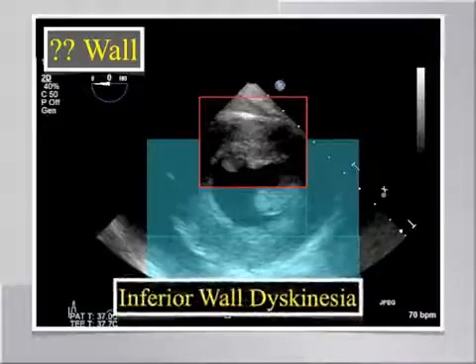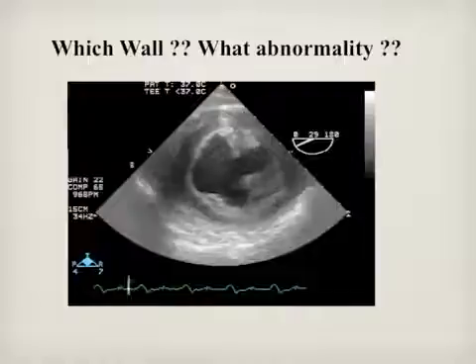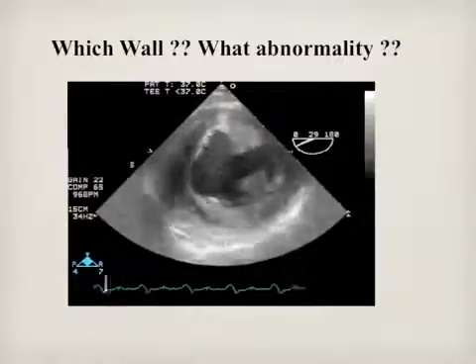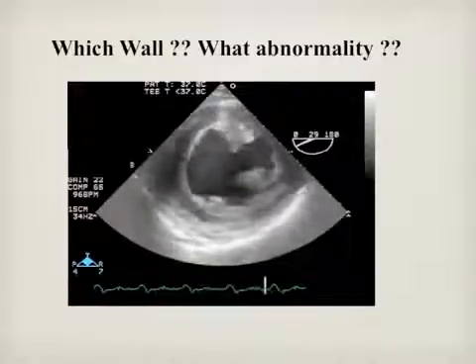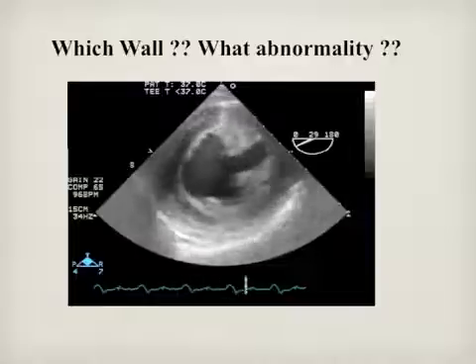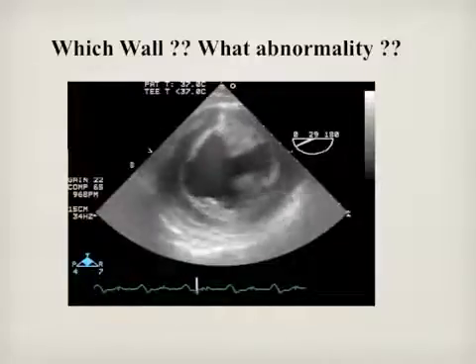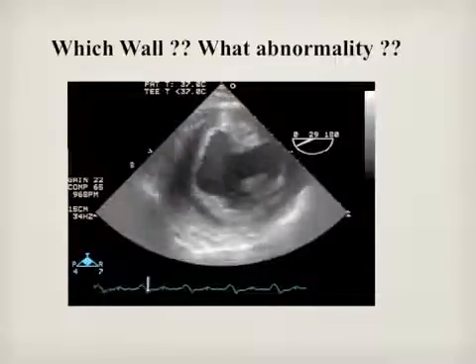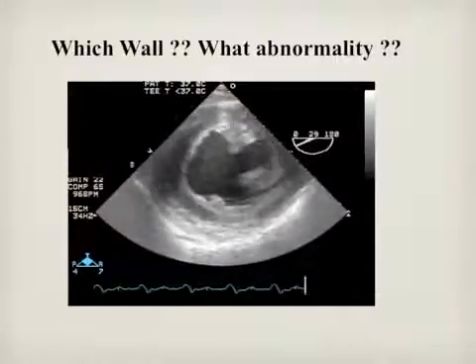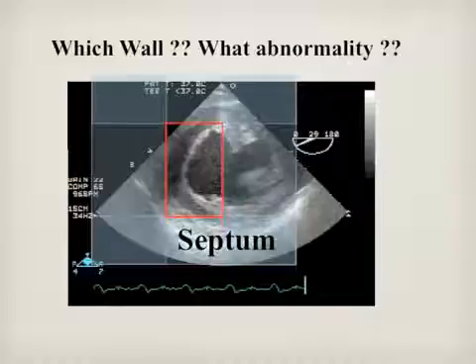Here we see inferior wall dyskinesis in the transgastric mid-papillary view. Please identify the view and wall motion abnormality in this post-bypass patient. Here we see atypical septal wall motion in the transgastric mid-papillary view.